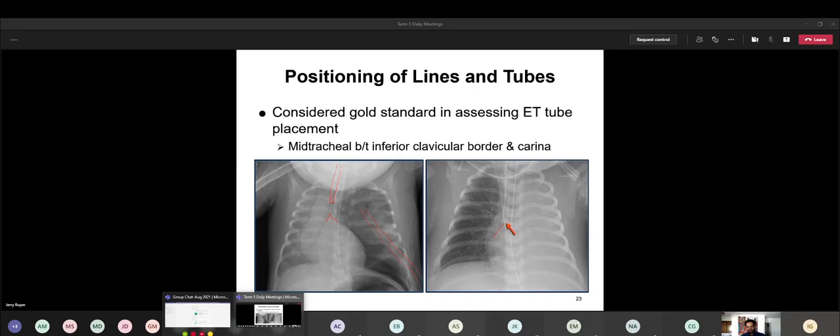And it even looks like there's air that's now surrounding the heart itself. I'm not exactly sure if there's a pneumopericardium happening, but it could all still just be the lung itself, as far as the pneumo that's happening in the lung, or at least on the left side here.